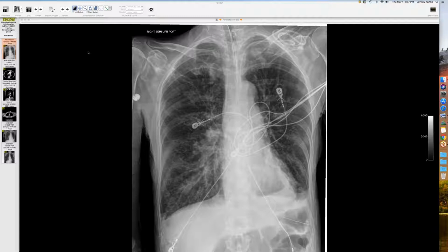This patient was transferred to us in such condition, and they repeated a radiograph here just to make sure all the support apparatuses were in expected location. And you can see this central line here has an odd course, and the point I like to make is when a subclavian central venous catheter really should be subclavian, and clearly this is not. Also, it's more medially oriented and overlies the aorta.